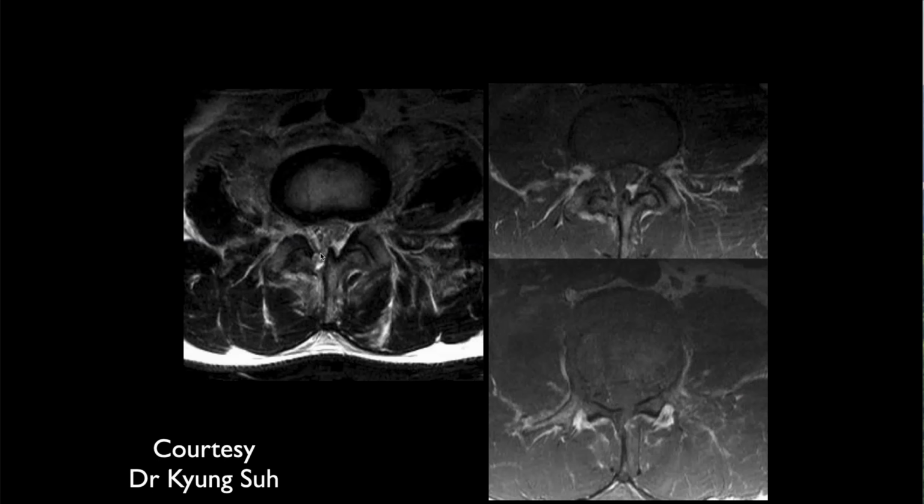And then if we do further imaging, paraplegia. Right, exactly. So what do you see with further images? You see extension of fracture to the right posterior element. So you've got fractures both anteriorly and posteriorly. So this is a very unstable fracture with probably a lot of compromise of that central canal. You don't see any fat inside of it on the T1 weighted image. Yeah, so this is a burst fracture, and this patient had a tear of the dura. So typical, as we talked about, burst type fracture.